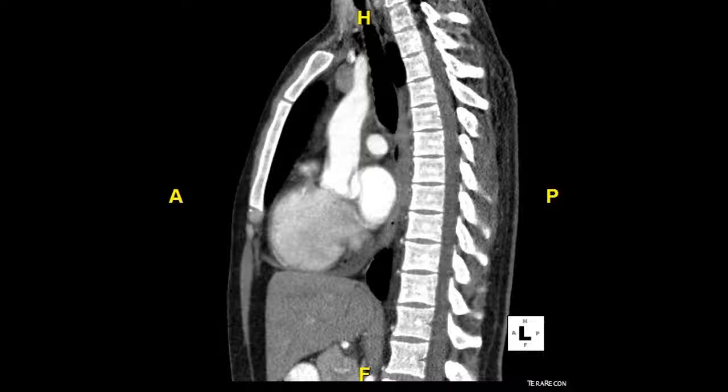The descending aorta has completely disappeared, but we can still see the ascending aorta, which I'll just outline very quickly in red. As we move through the next few images, keep your eye on it and notice how it lies. From here, we will be moving laterally to the right side of the body. Keep in mind that the structures of the mediastinum are not symmetrical on the left and right sides of the body, so the images will look a little different than the ones from the beginning of the presentation.